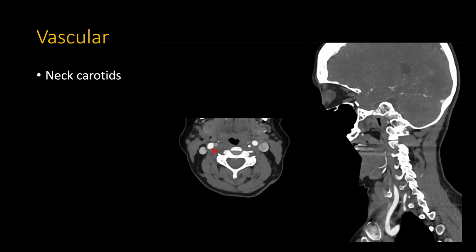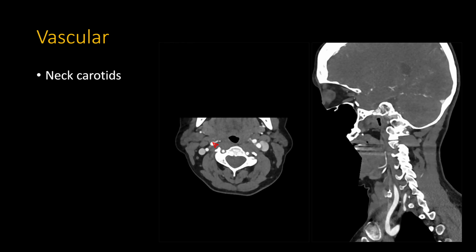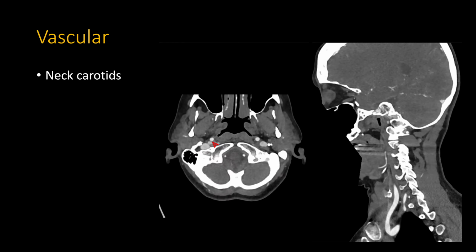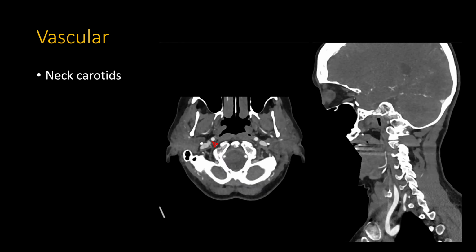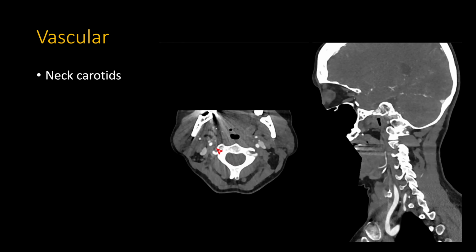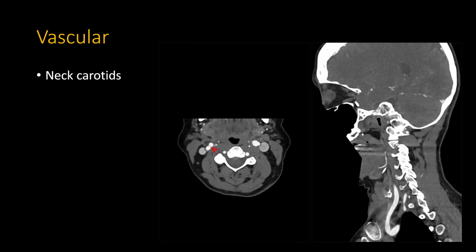The bulb obviously is where the common carotid artery right here separates out into the external carotid artery and the internal carotid artery. The external carotid artery, you can tell it's the external because it immediately starts giving off branches, while the internal carotid artery goes all the way to the petrous canal without any branches. Very occasionally, the internal carotid artery will have some of the branches that typically come off the ECA, but we don't need to focus on that for the purpose of this basic presentation.